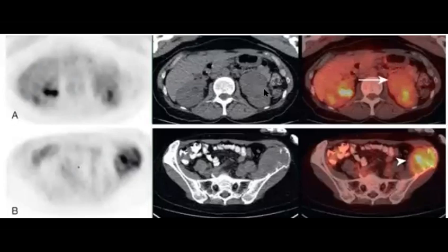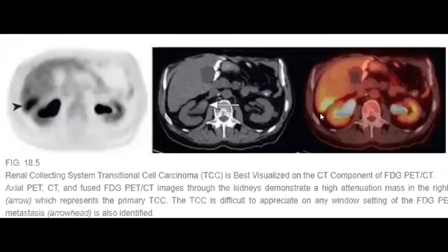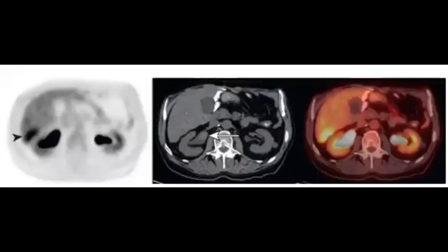But when you go and check the CT and you see that there is a renal mass, it will be the origin. So as you see, sometimes it doesn't have, yes, okay? So this was renal cell carcinoma metastatic to the bone, okay? Yes, what about this one?